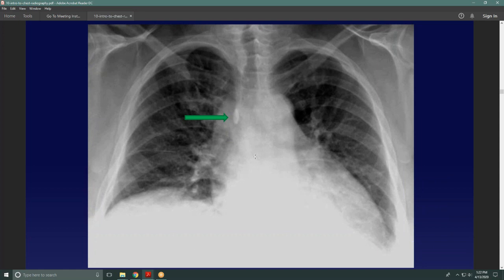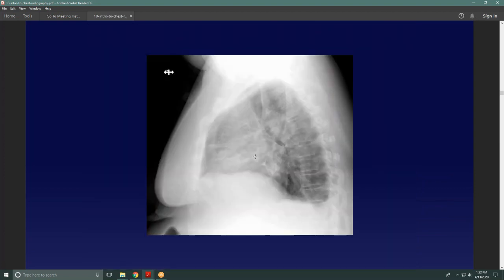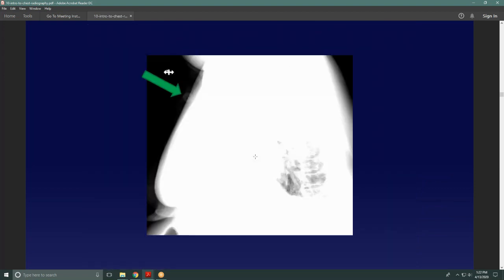Well, this is where the lateral radiograph can come in helpful. A little harder to see here, but if we zoom in a little bit, see that over there? Can you kind of see those holes right there? Anyone have a guess what that is? A swallowed button? A button. Yes, it is a button.